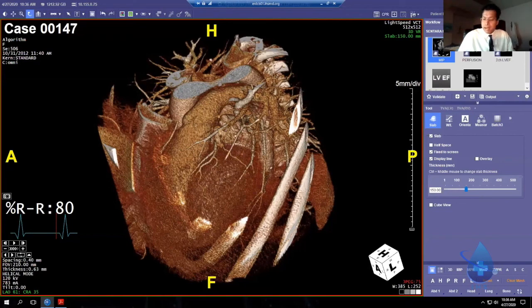The mouse moves are the next buttons, and then we'll be done with buttonology. You guys can do this, and for the first day you're going to be a little slow, getting some muscle memory with the mouse moves, so it'll take a day to get comfortable with the mouse moves and the buttons. But once you do, then you really start flying and absorbing pathology really quick because you're not thinking about the mechanics of how to run the workstation.